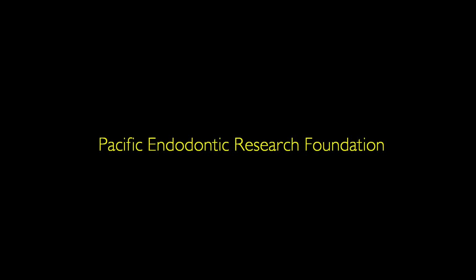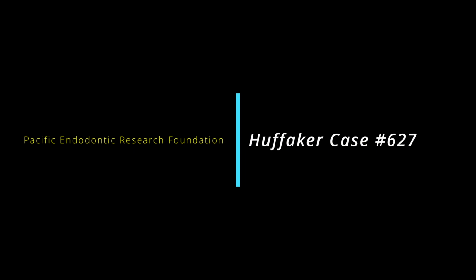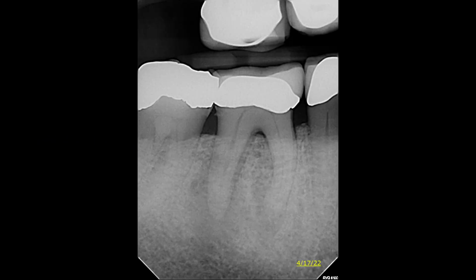This is the final report of findings on Dr. Huffaker's case number 627. The periapical shows tooth number 30 with periapical radiolucencies around both the mesial and distal root and what looks like a porcelain fused to metal full coverage crown. There is an opposing dentition.